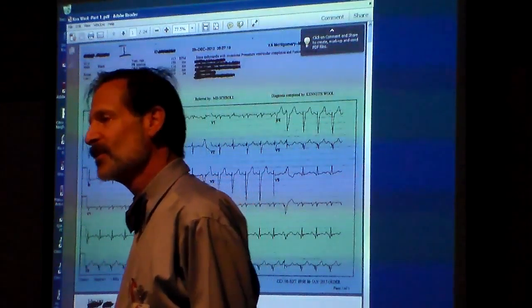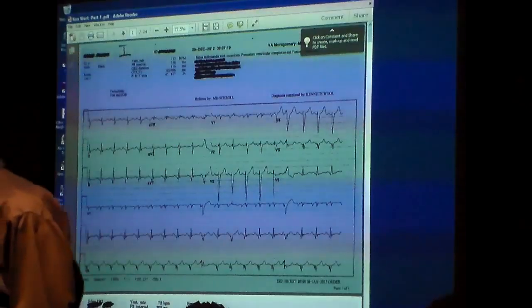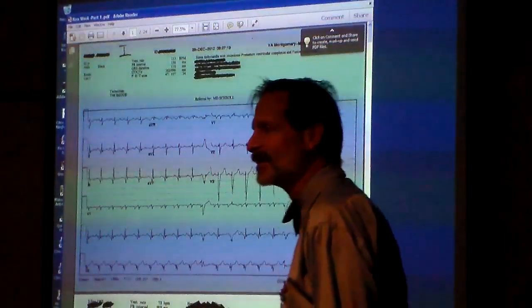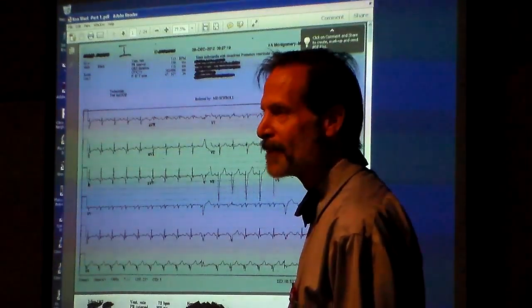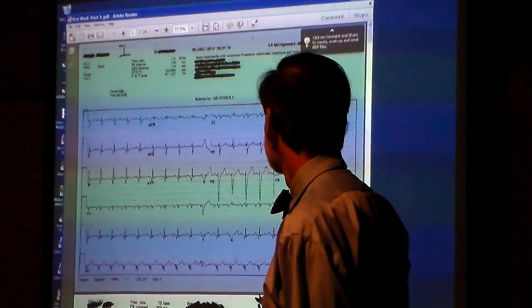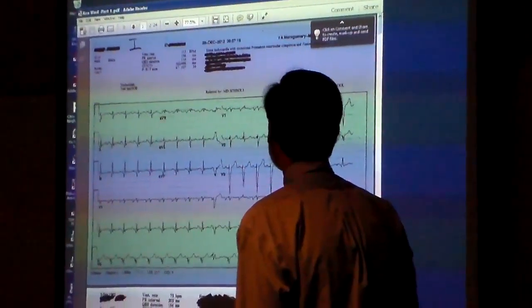Yeah. Are y'all asking for? No, it's recording. Okay, who is going to interpret the first EKG for us? Tell me that. Yeah, please, you can. But he has to talk slowly while he does it. Yeah, really? When I don't know what I'm talking about, I talk slow.